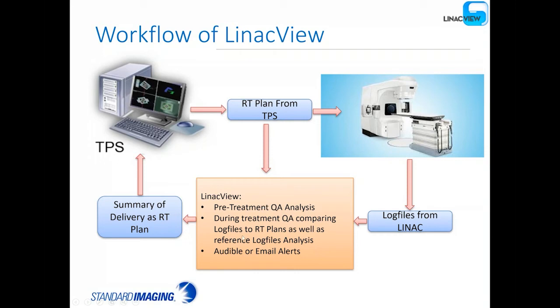Then there's a mechanism where you put in your tolerances, and you will receive audible or email alerts from the system as soon as the patient delivery is complete and the log files are received by LinacView. For a particular patient, that would usually be before the patient has even left the clinic.